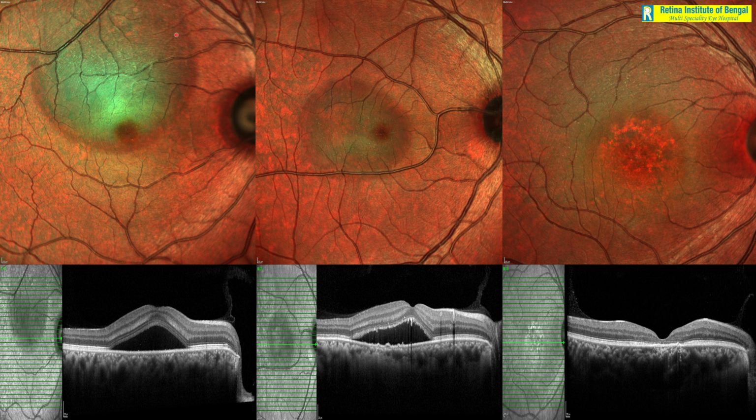And therefore we know that this CSC, which is in the acute stage with no evidence of any RPE changes, can be observed, but this one we probably need to intervene. This is obviously a patient where the CSC has resolved, but it has left behind a large patch of RPE atrophy, which can also be confirmed on the OCT. You can make this out clearly, that the fovea is thinned out.